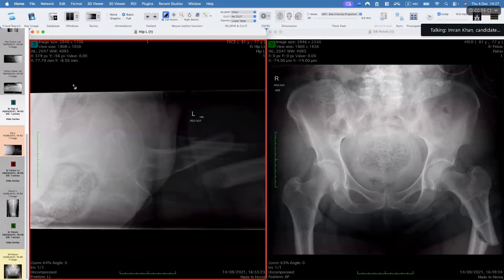They're fine. Tell me what you think of the fracture. There are no other findings. Don't worry about osteoarthritis and everything. What do you think of the fracture?